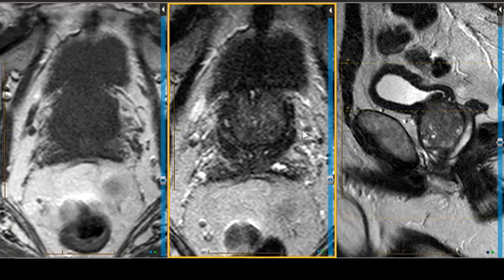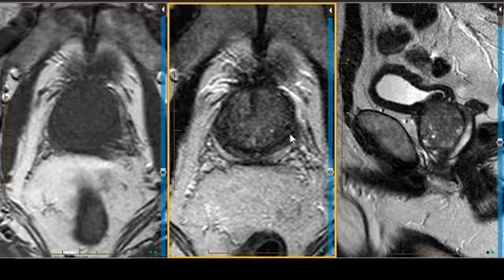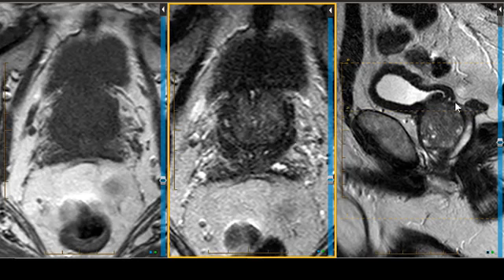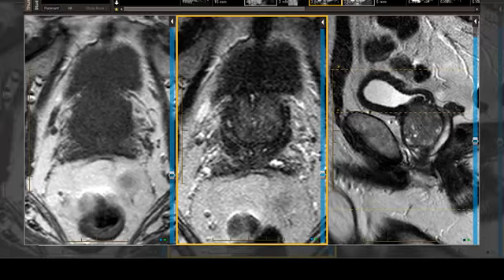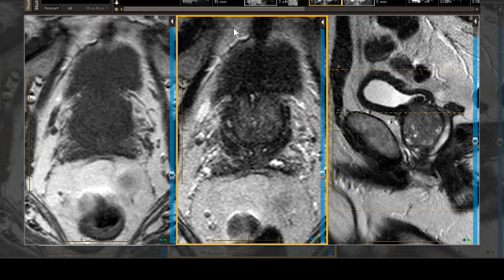So now we're up high, and in the posterior-superior quadrant, up high, you run into some central zone. So where is the central zone in the central gland up high? Going to be in the back. So let's make that, I like green for the central zone. So let's get something nice and green, and the central zone is going to be here. It's going to have kind of an arc shape to it, and it's really not very distinguishable from the transitional zone. But that would be about the area of the central zone.